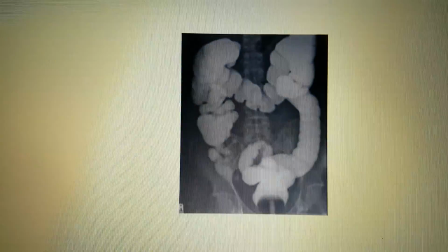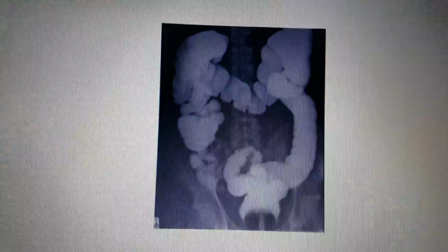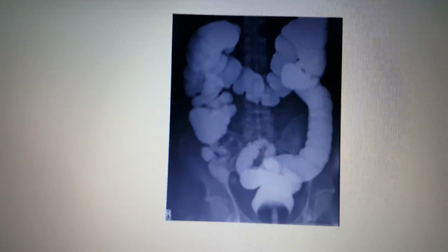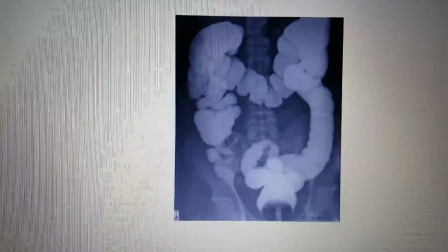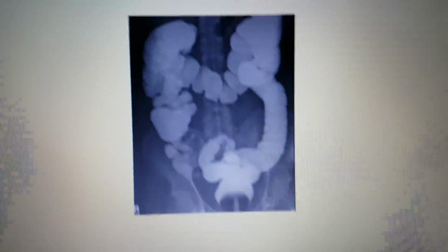Next is the PA axial, and for that, you want to see the transverse colon filled with barium again, no rotation. You're going to want to see the rectosigmoid area with less superimposition. You want to see the entire large intestine and optimal exposure factors and your marker indicating your anatomy.